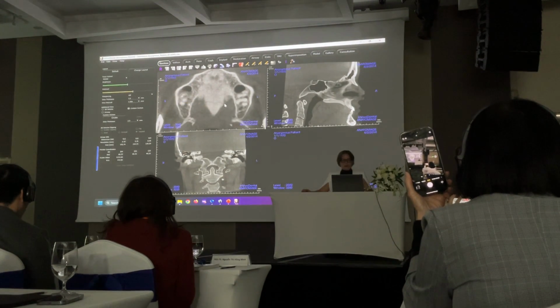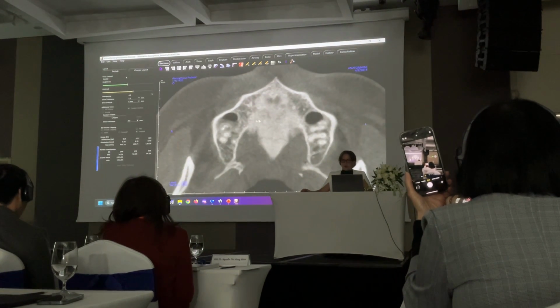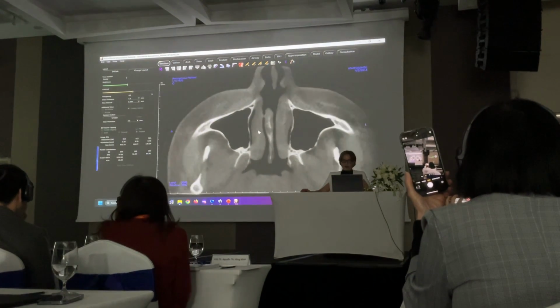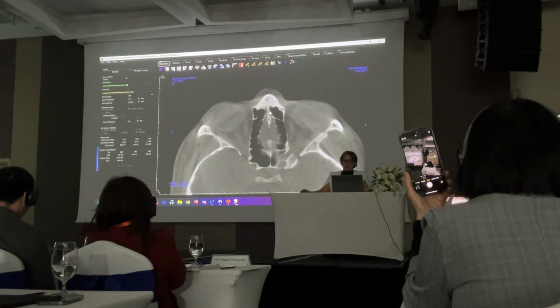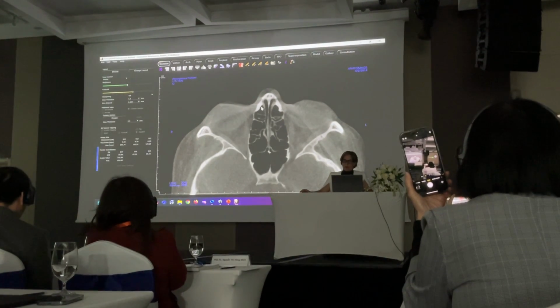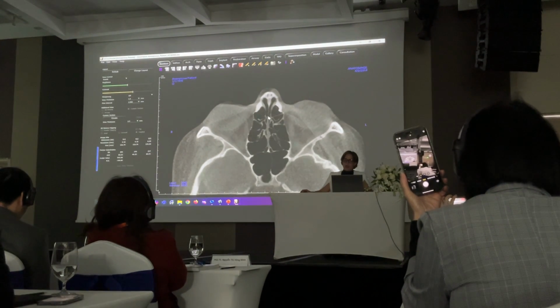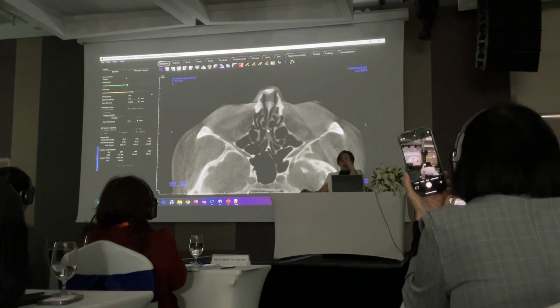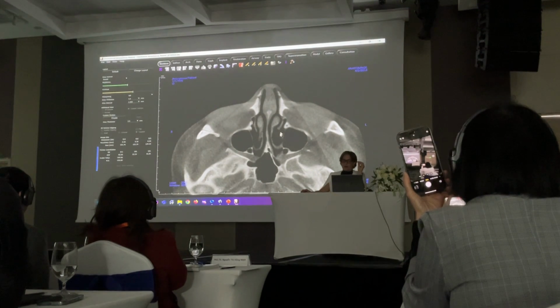Okay. So, going back here. So those are the sinuses. Okay, so now we're going to go all the way back up to the top of the nasal cavity. The top of the nasal cavity, we're comparing the two sides to one another. This is the nasal septum. And as we're going down, we're looking for any deviation in the septum, any breaks in the septum, and any abnormalities. We want there to be air-filled spaces around the turbinates.